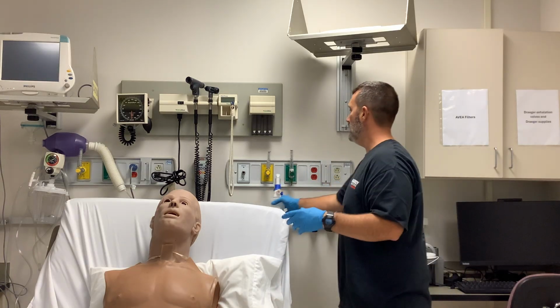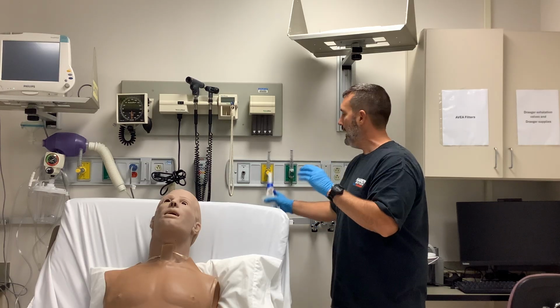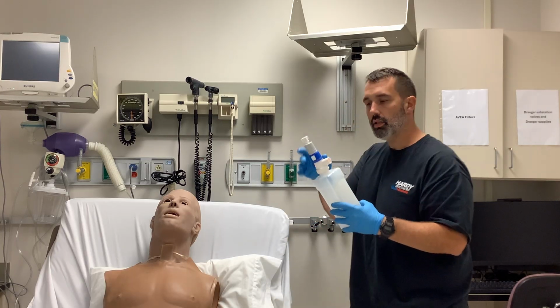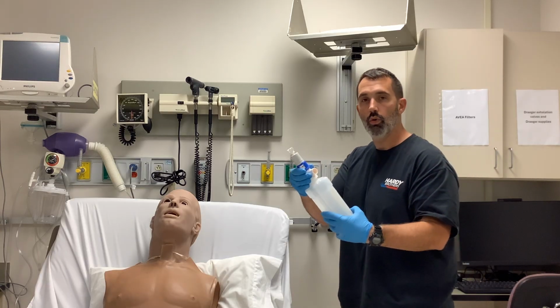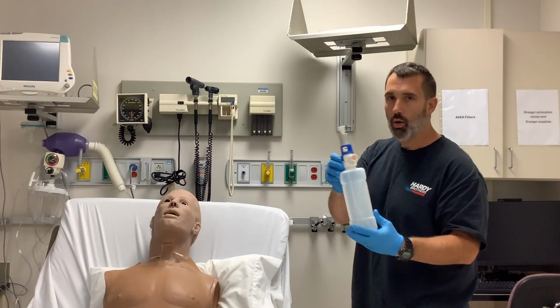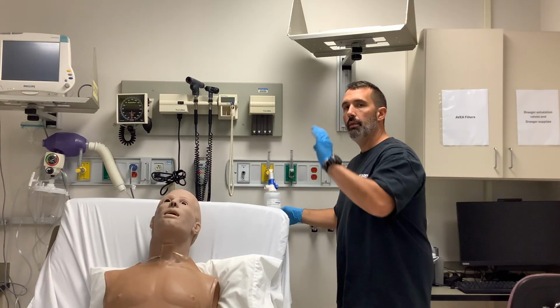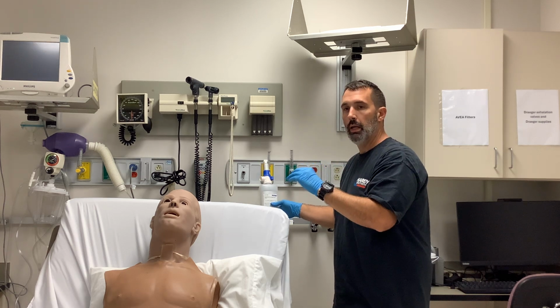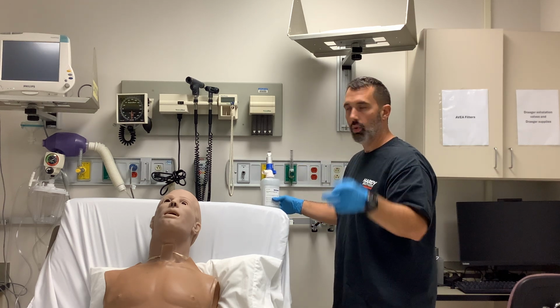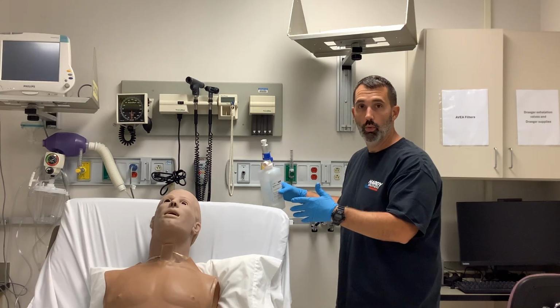an air flow meter. If it's attached to an air flow meter, I don't care what you have this collar changed to, whether it's 100%, 70%, 50%, 40%, 35%, and so on. Don't care what you change this collar to. If it's on the air flow meter, the only percent of oxygen possible that's coming through that system is 21%, because 21% mixed with 21% is just 21%.